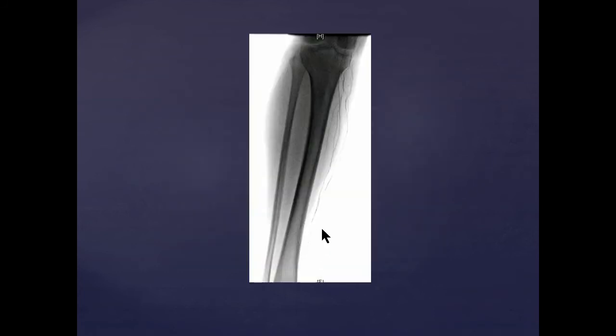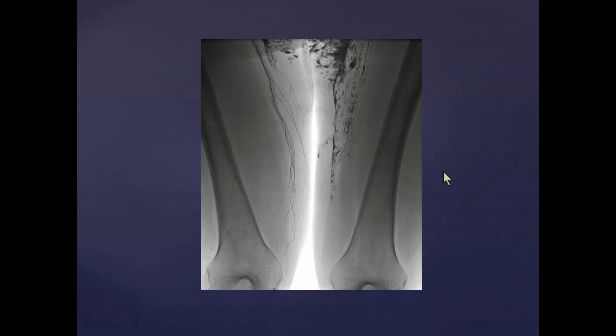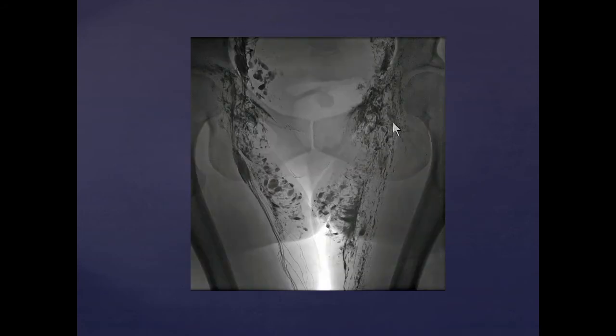So here's her lymphangiogram, normal calf, and you're going to see a pattern here. Most of the times things are very normal peripherally, but then stuff starts happening. And as you can see, as we're getting up into the thighs, this is clearly not normal. The right side looks very normal. The left side is doing something peculiar.